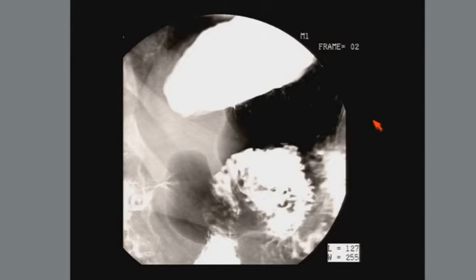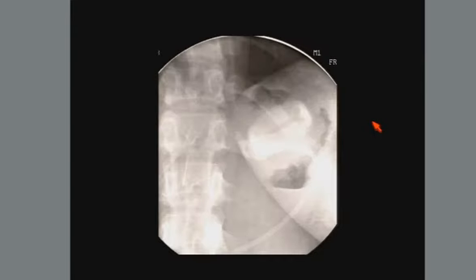Now, this person has a lap band, but you don't know it because, unfortunately, a protocol upper GI study was performed, which is not helpful in this case. You don't need to perform a double contrast study because it precludes you from adequately evaluating emptying across the band. That's why it's important we obtain good history to start so we can do the appropriate exam.